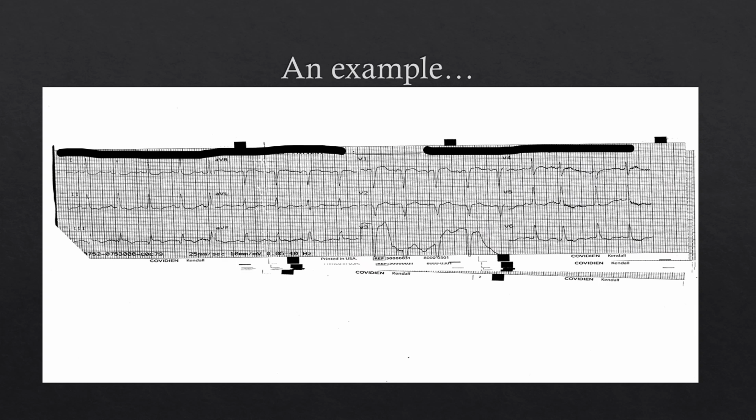So let's look at another example. This is a much more subtle case. So this patient was a middle-aged patient presenting with not really overly concerning symptoms, kind of a benign presentation, but no history, healthy, took care of themselves. We look and we see this ECG and we start applying the checklist.